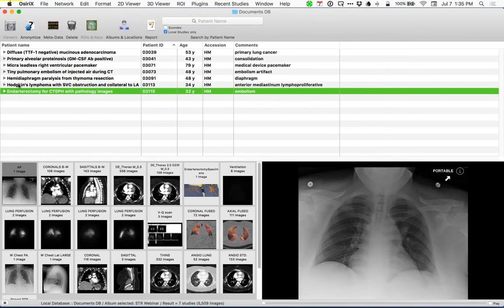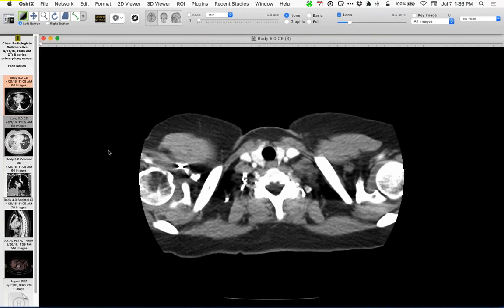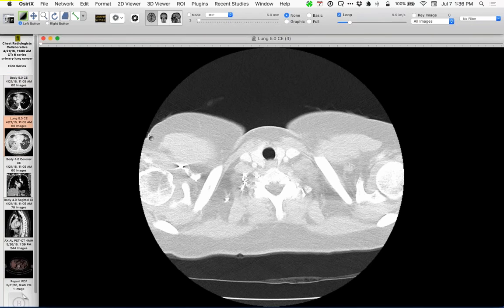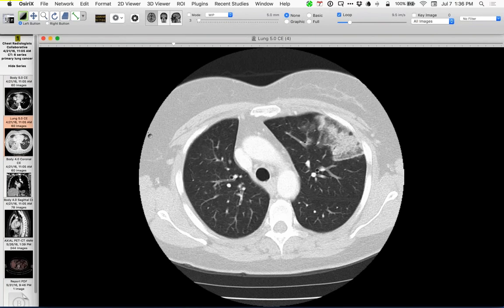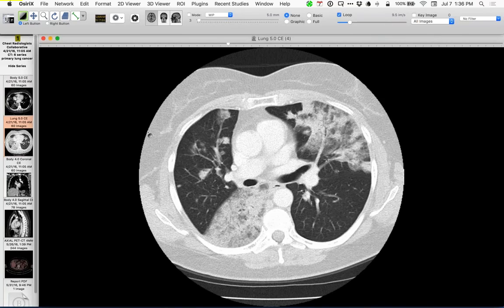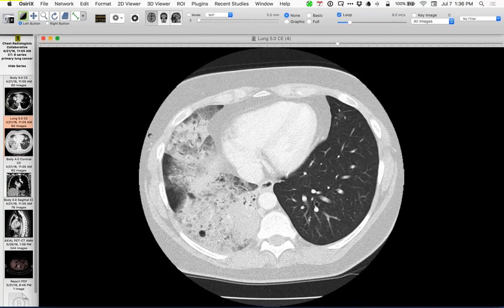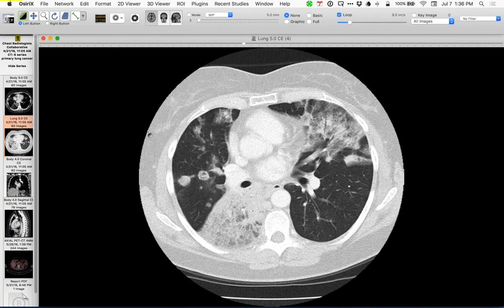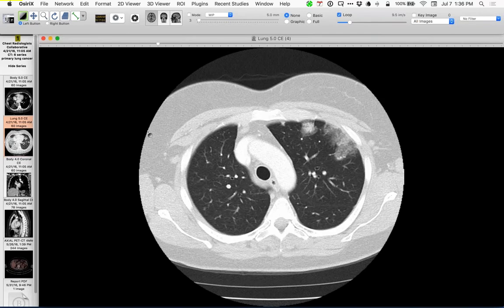All right, I showed you the really neat cases. Well, I'll show you this one too. We've shown many examples of this before, but it's the case of the consolidation that isn't pneumonia. So I think the history here is of persistent opacities initially diagnosed, and we've seen so many examples before, as pneumonia that isn't pneumonia. And of course, this is an adenocarcinoma. In terms of teaching, it shows all those features.